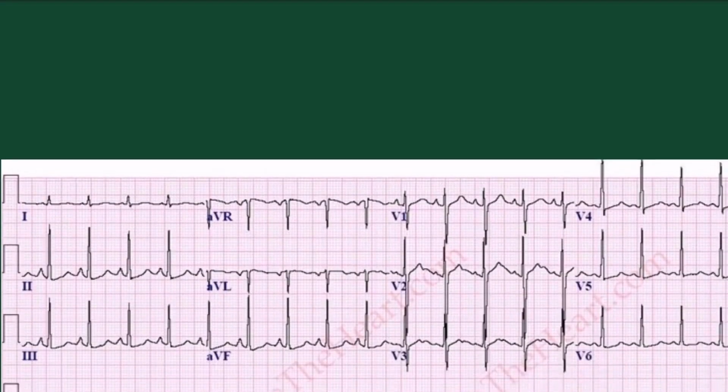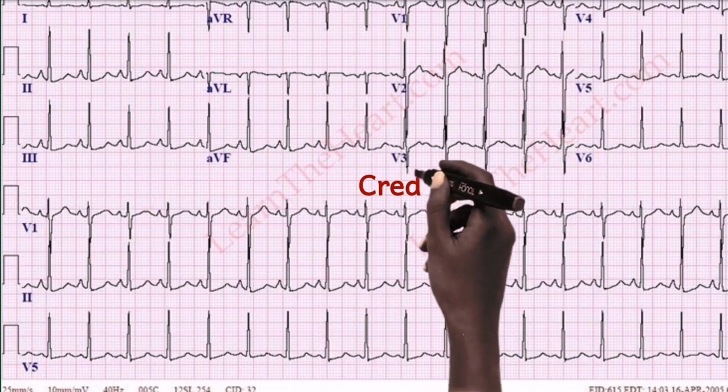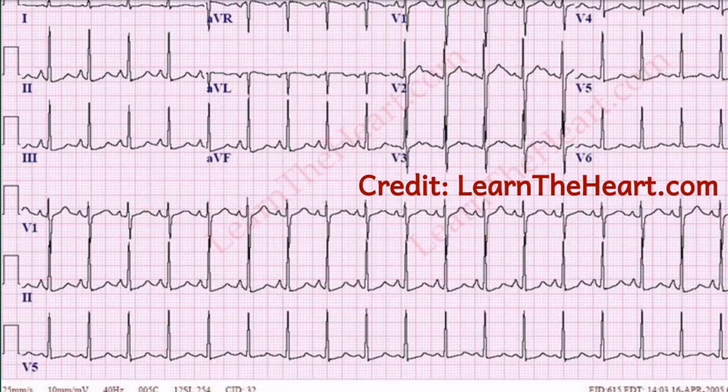Very good. And so on this slide, I want to interpret a sample ECG report from step 1 to step 6, ending on the P wave, so you can appreciate our journey so far. But first, let's acknowledge the source of this ECG report. I got it online from learntheheart.com.